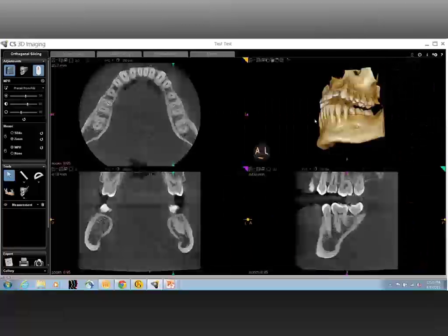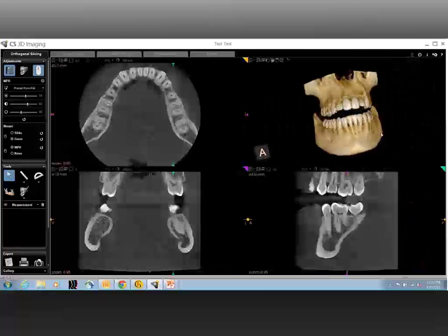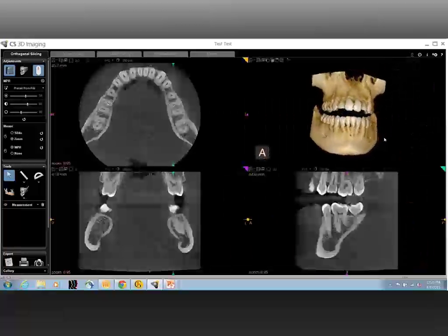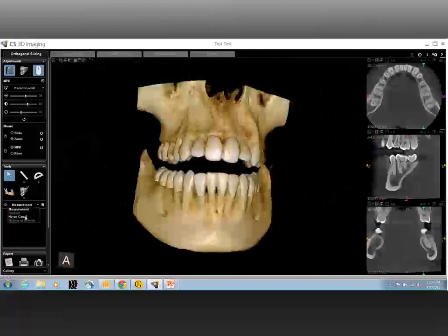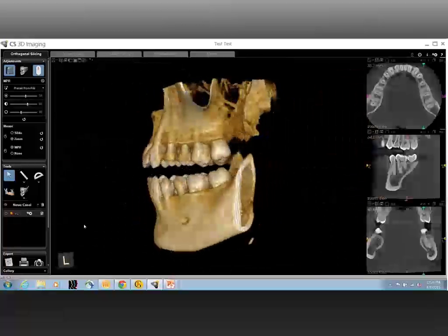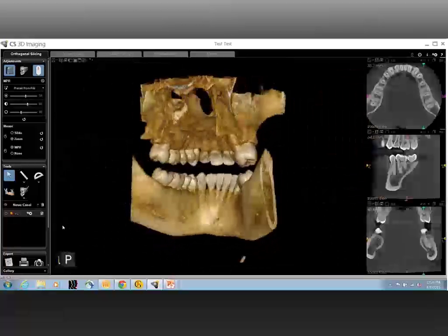To pick up from the previous question, yes, that is absolutely correct. Those are the three things to start with. And of course, as we expand the horizon into interpreting or going through the images, a few things to look for. Number one, the inferior alveolar nerve canal. Everyone knows that that's one of the most critical structures that exists in the mandible. So identifying the inferior alveolar nerve canal, identifying the course of the inferior alveolar nerve canal, is very important.